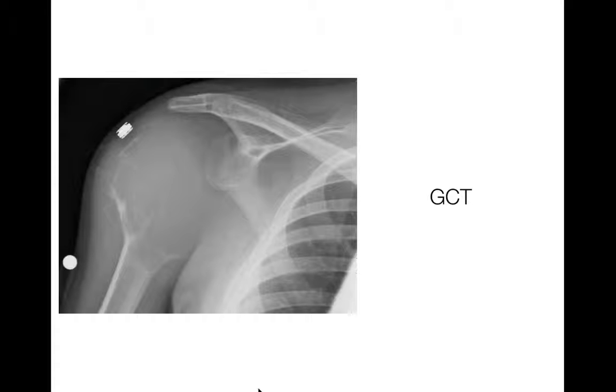Again, could this be a metastasis or a plasmacytoma in an older patient? Sure, it's possible. Age is an important factor in making that differential consideration, but for this location, this appearance, I think ABC and giant cell tumor in a young patient would be your top choices.